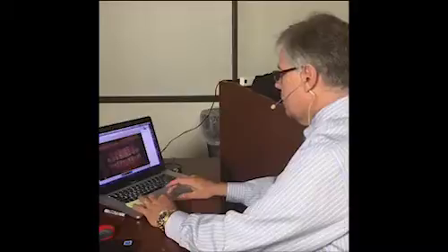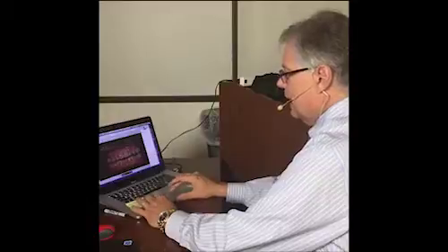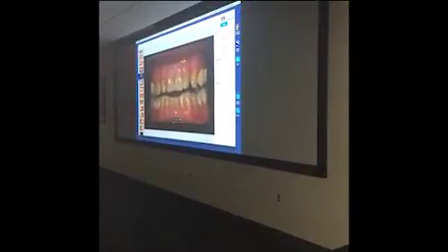And now I can begin to crop things, move things up, just like in any other program and lots of places. You can crop whatever it is you'd like out of the image. Okay, and then you can move that image once you've cropped it. If you want to make it bigger, you just click off, but have it still be selected. Now I can make it bigger if I want to.